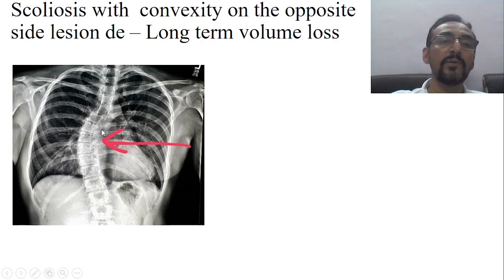Okay, again you have to look into this particular portion also and look at the ribs very clearly visible here. See how they are normally, as far as ribs are concerned, this is normal. The ribs are obliquely faced, they are not straight. In the previous picture it was straight. Now again you comment on the position of the medial head of the clavicle. See, the medial head of the clavicle is not present equidistant from the paravertebral line. The reason is the whole spine has bent, so because of this its position has also altered.